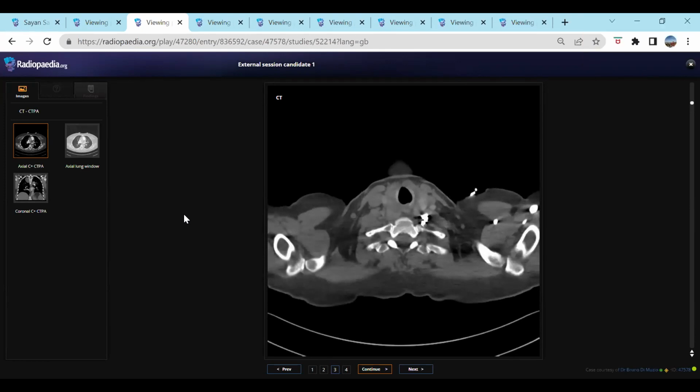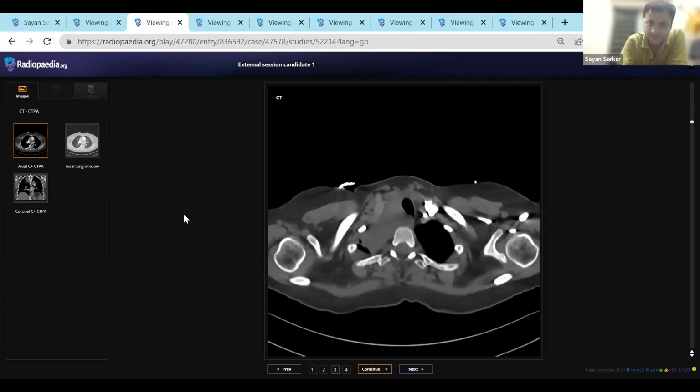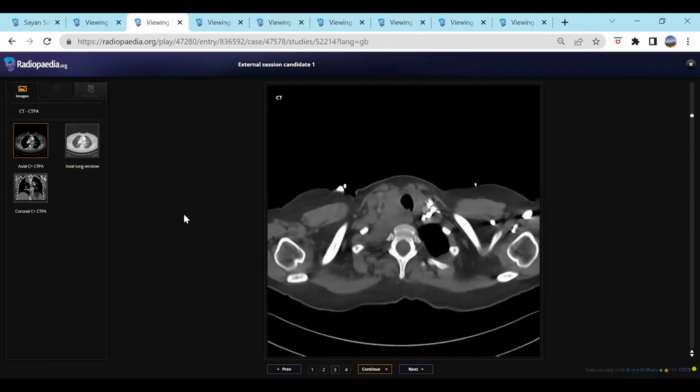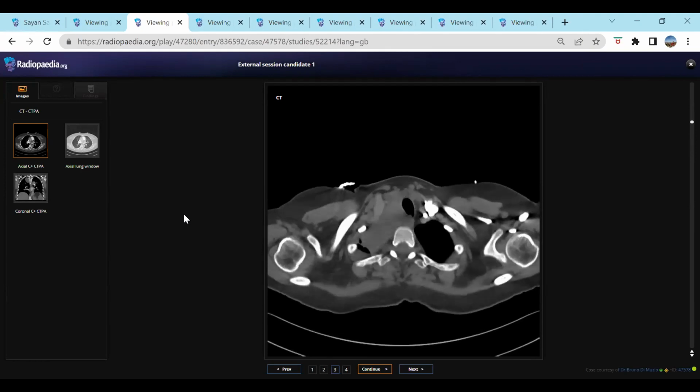Thyroid. Yes. Why not with the thyroid? You cannot see the right lobe, right? It's very indistinct, but I'm confused about the density of the lesion because it looks slightly fluid to me. So if it is coming from the thyroid, and as you say it's fluid density, what is it?